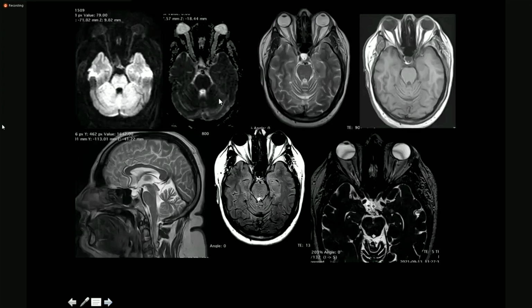The pons, there are subtle abnormal signals in the medial temporal lobe. In the pons. Nothing in the medial temporal lobes. Okay. Focus on the optic nerves. Ma'am, the course of the left optic nerve appears to be slightly tortuous on T2 and on this CISS sequence. Can you see some extra CSF in the perioptic sleeve? There is slightly tortuous course of optic nerve, and there is increased fluid in the perioptic sleeve.